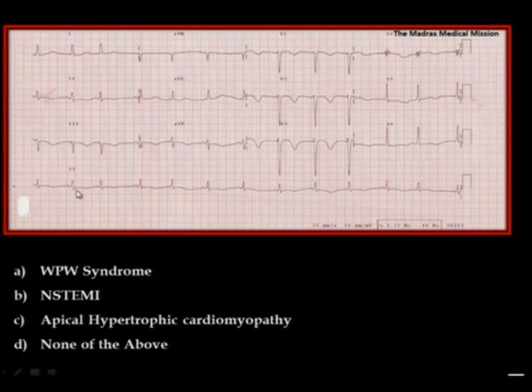Well, if you look casually, there are PQRS complexes which are connected closely, obliterating the normal PR interval. Look at this. This is the PR interval which is short. PR interval is short, PR interval is short. So it suddenly raises the antenna regarding pre-excitation because of an accessory pathway. However, that relationship no longer exists beyond these 3-4 complexes because the P tends not to give rise to the QRS. For example, in this particular one, the P is probably hidden here, and the P is probably merging into this QRS here.